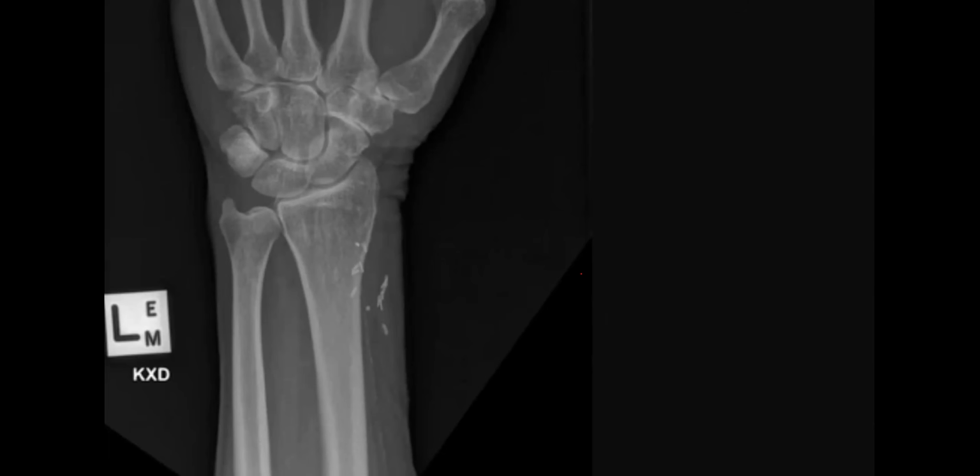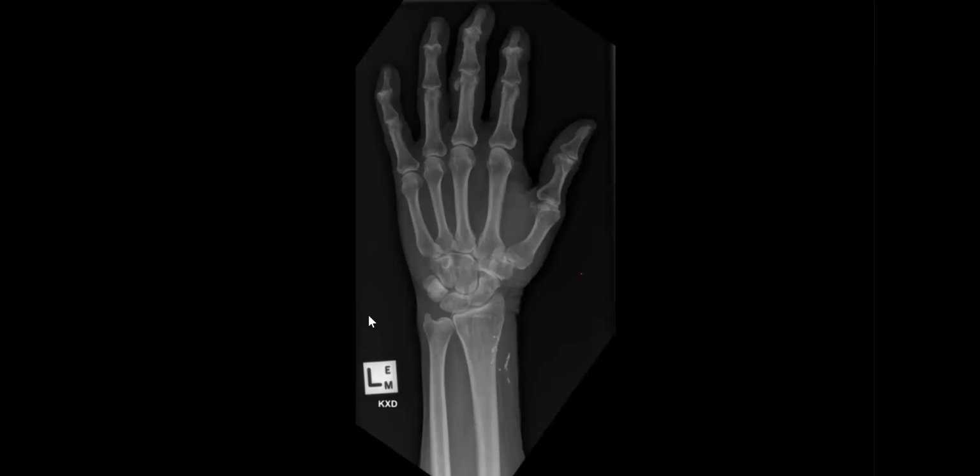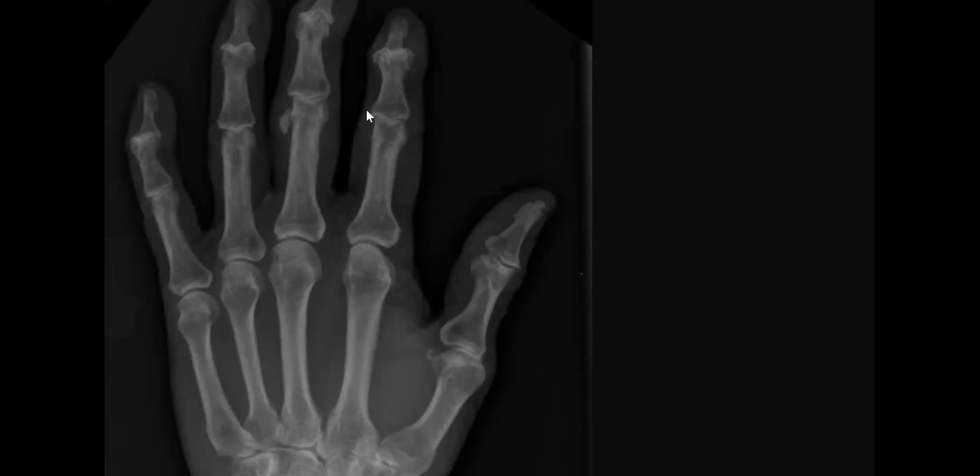What about this fine line? So this is arterial calcification. Yes, vascular calcification. But the patient is 25 years old. Okay. Step by step. What about this type of arthritis? Sir, involving the distal interphalangeal joints with calcifications, I will go for metabolic diseases. Step by step. This is the seagull again. You see it? Yes, sir, seagull.